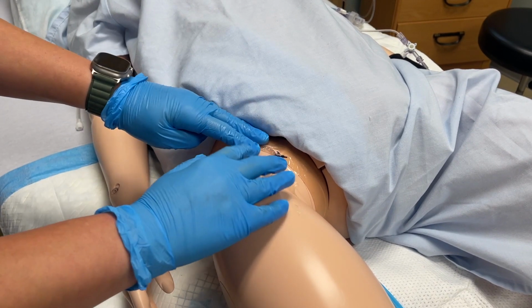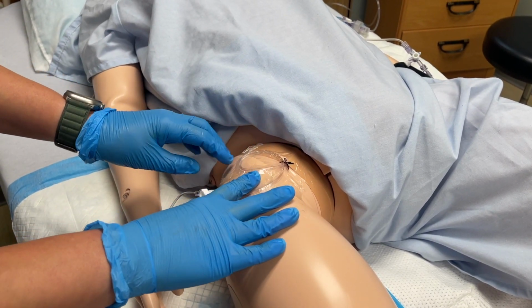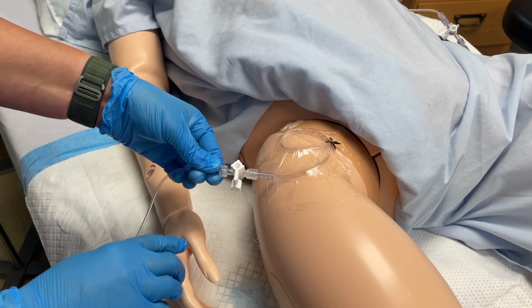First, let's collectively look at all the pieces of an arterial line setup. Here we're looking at a femoral access site. You'll notice the X on top of the tegaderm, and that is our simulated access site. When you feel the tubing, you will notice that it is very rigid. It maintains high pressure within the line in order to get accurate readings of the patient's blood pressure.